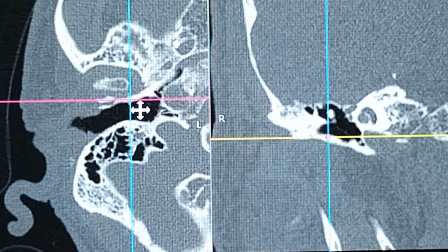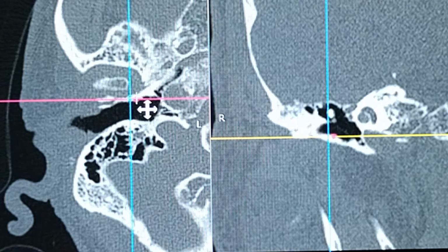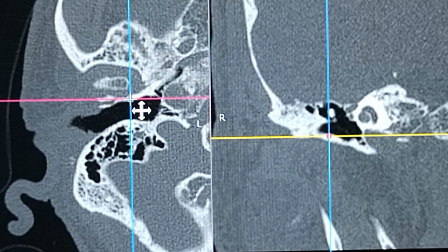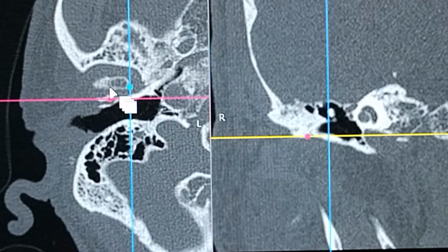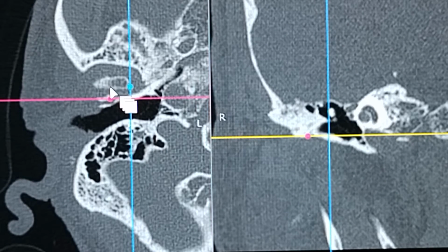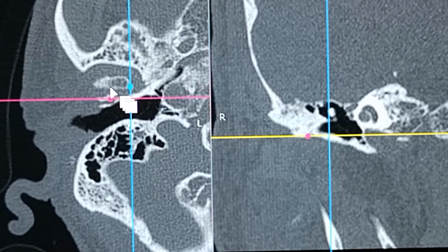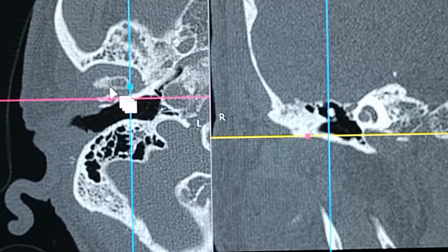And if you drill that during basically a canaloplasty, or a thinning if you have a narrow EAC, and you drill that wall too much, the joint is going to prolapse behind and come back into the EAC, and that's going to be a problem to the patient post-operatively. So that is the clinical significance of that area, and that is why you should know that the TM joint, that is the mandibular fossa, is in very close relation anterior to the external auditory canal opening, that's the anterior tympanic wall. Okay, so these are the 3 points which you should be knowing to start your HRCT temporal bone.